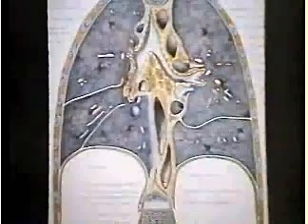Let's move on to one more region. This is an important region in the study of the chest X-ray, and it's turned out to be a very important region in the analysis of the CT scan. Now, it's a very difficult region in the chest X-ray. I'm talking about the subcarinal region.